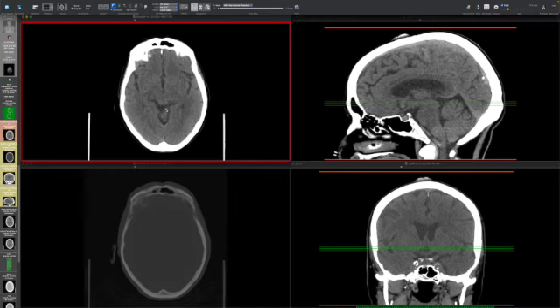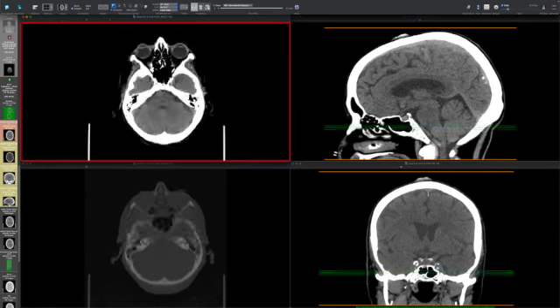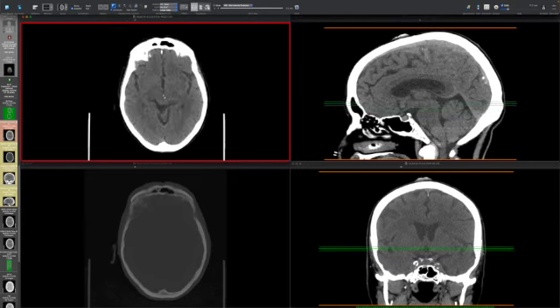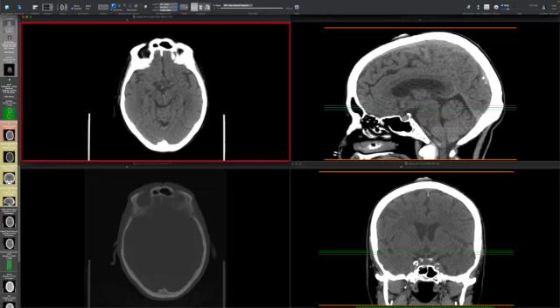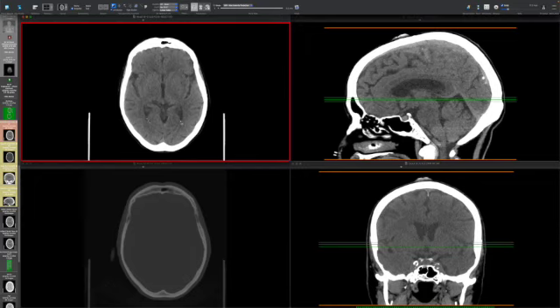So we've assessed the basal cisterns. We're going to do one last check for subtle areas where we look for subarachnoid hemorrhage. That's going to be the interpeduncular cistern, which is this little space at the back of the suprasellar cistern between the cerebral peduncles. We're going to look at the dependent portions of the atria and occipital horns.